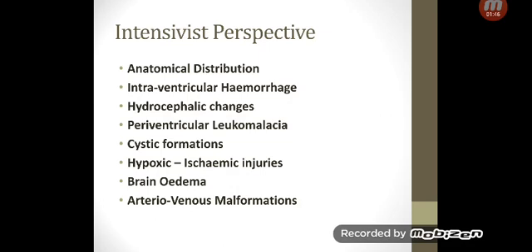Now you know what is normal, so you need to make sure that you're seeing what's normal where it should be. You should be sure that there's no midline shifting, that the falx cerebri is where it is, and that there are no abnormal structures that you're not familiar with coming up on your scans.